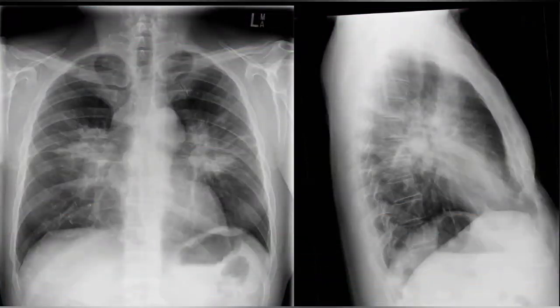Sir, I am provided with a plain radiograph of the chest, frontal and lateral view, of a skeletally mature patient. Here I can appreciate abnormal areas of opacification involving bilateral parahilar regions, extending from the perihilar regions to the periphery of the lung. No other lesion is noted. Bilateral CP angles are also normal.